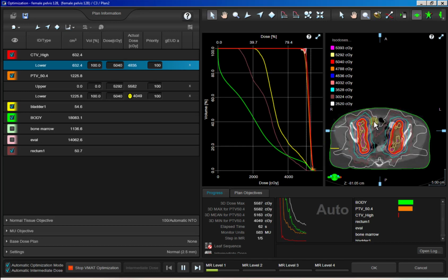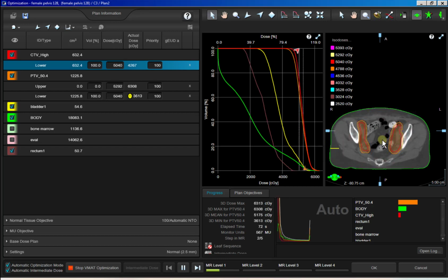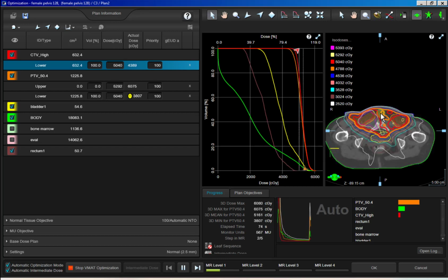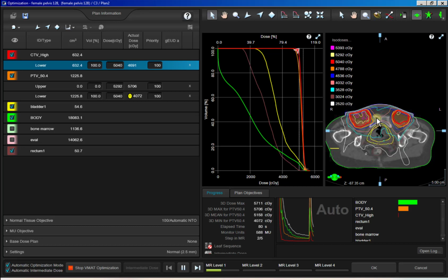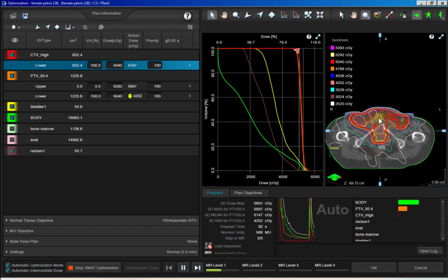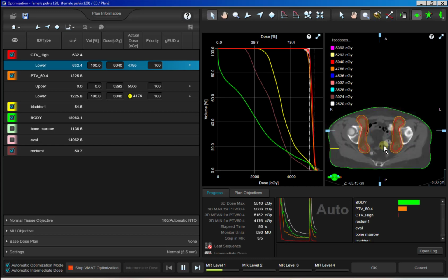If our high dose lines did not break up in between these sections of the PTV, then I would try a different collimator angle. I would add a third arc, something. You should be able to get your dose to always break up like this.